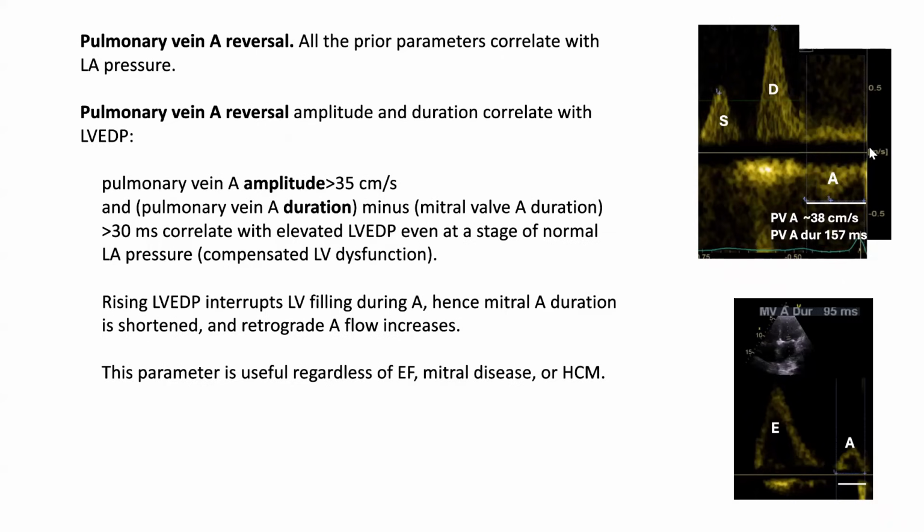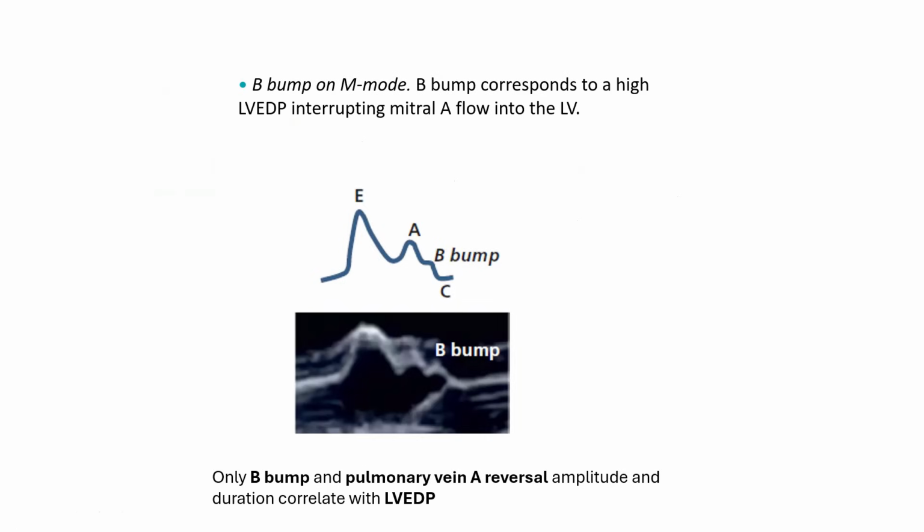And they are very easy to calculate, the amplitude as well as the duration. You just measure the difference in duration between this and that. And there is one more parameter that correlates purely with LVEDP.